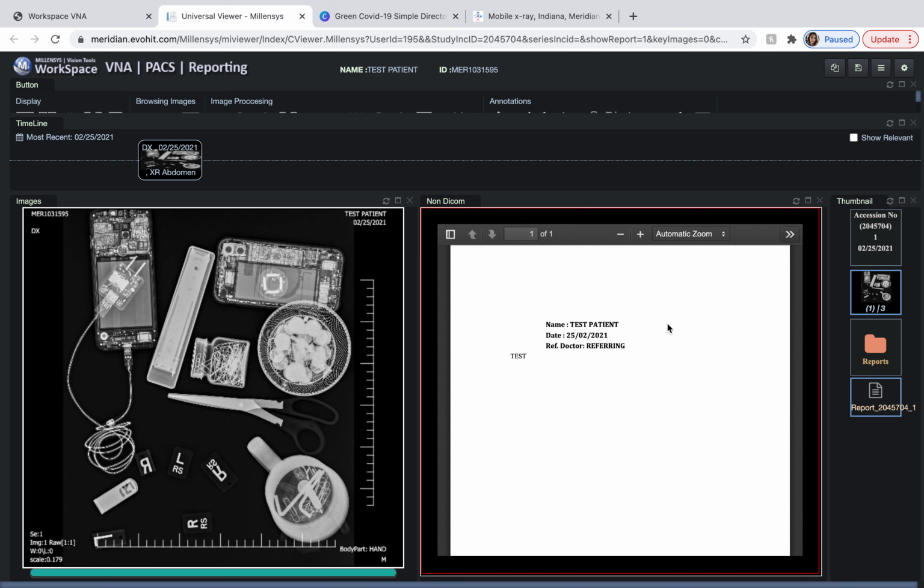It should automatically get faxed to your facility as well. Typically, that's how we set up all of our portals, where it automatically gets faxed to you. But if you want to get on and manually pull it off, you can do it here. Say you want to pull one that's a year old, you can get on here and pull that report.